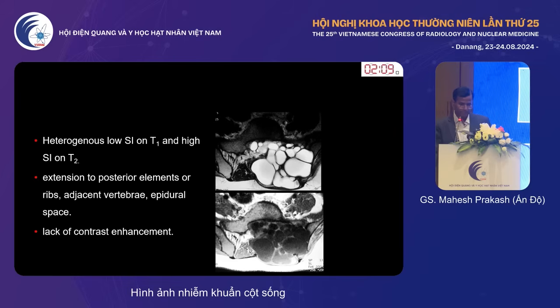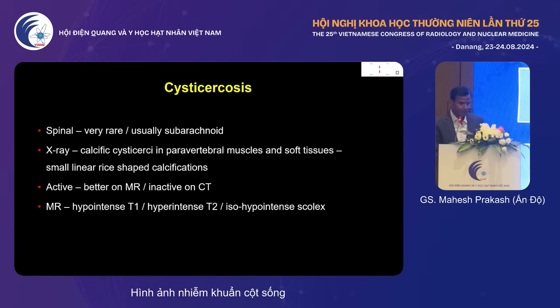Again, this is the axial image of the same patient, and you can see similar features as in a liver cyst or any other hydatid cyst. So similarly, the imaging features are nearly similar.